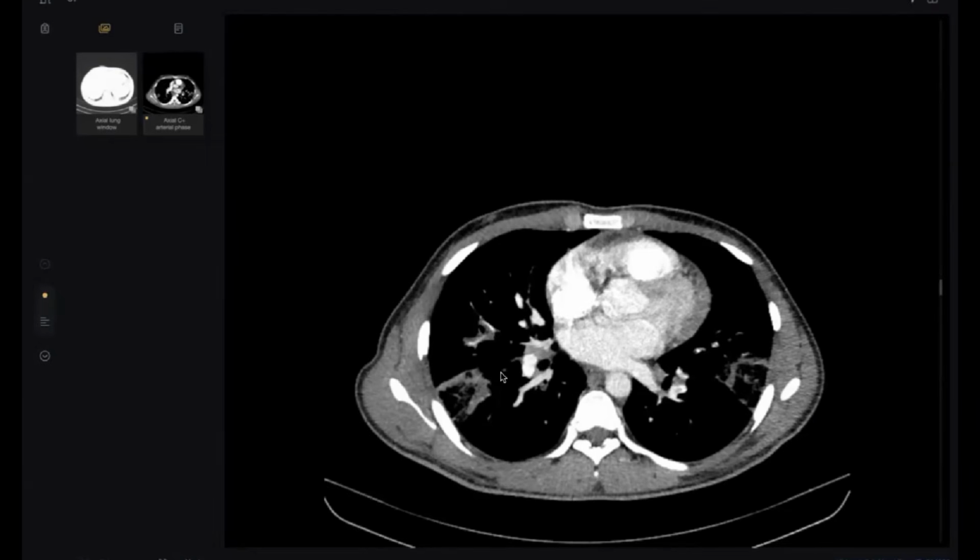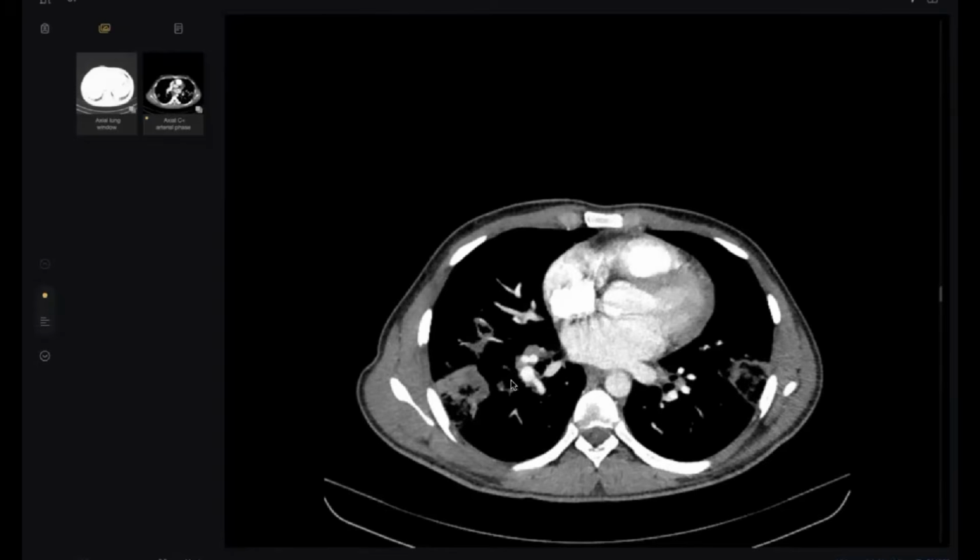You can diagnose a cavitary lesion upon conventional pulmonary embolism if the patient is a known patient with pulmonary embolism since 1 to 3 weeks. After conventional pulmonary embolism, some cavitary or cystic changes may occur, but this patient is very acute. This patient of today, it is impossible to cavitate within 24 hours. So the first possibility is septic embolism.